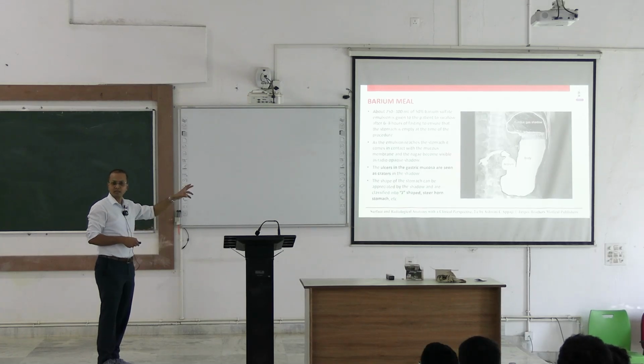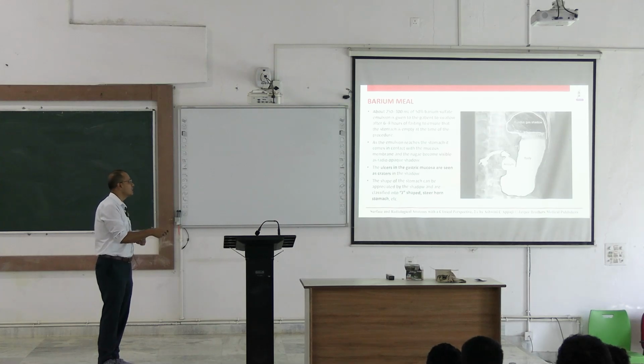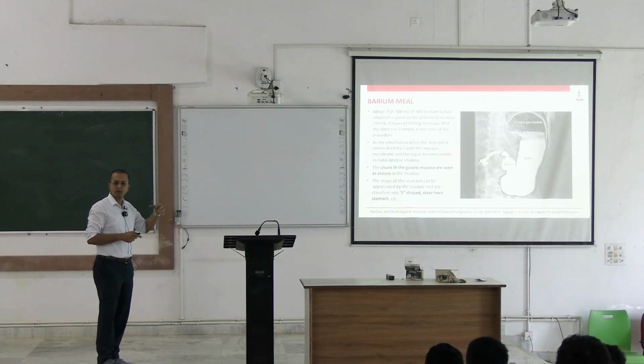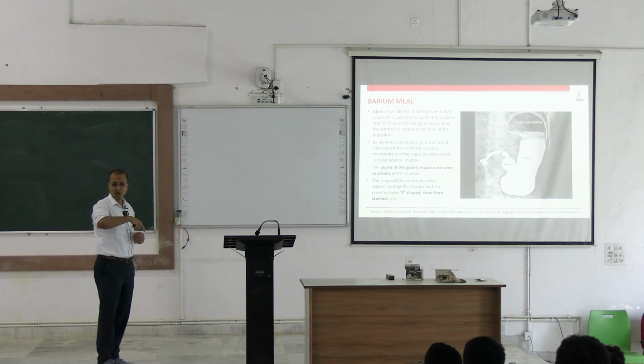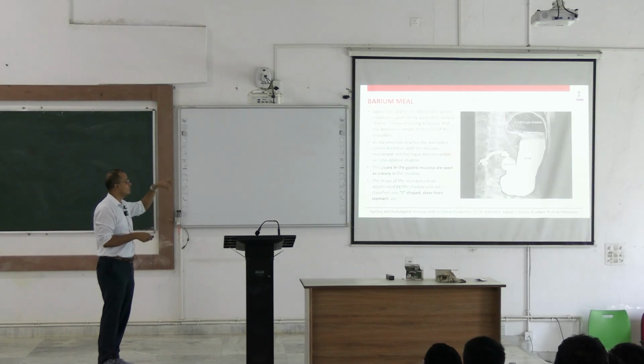While it is passing through the stomach, if you take this X-ray at that time, you can visualize the interior of the stomach, like parts of the stomach, fundus, body, pylorus, and jejunum, ileum, like that. So you can see the interior of the stomach, which normally cannot be seen. That makes it a special one using this special dye, which is known as barium sulfate. That barium sulfate illuminates the interior of the lumens, and you can see this particular region. You can see the rugae. You find these craters.